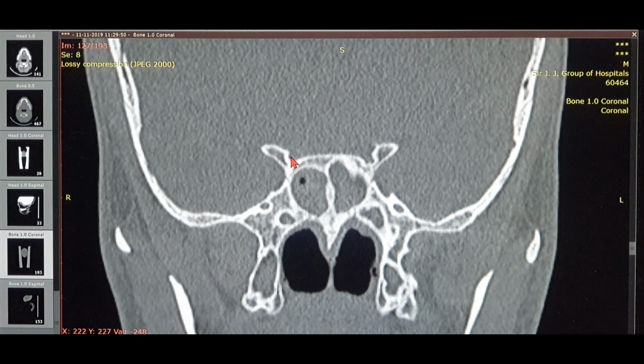Grade 1 is that the sphenoid sinus does not have any bony indentation of the optic nerve. Second is that slight indentation of the optic nerve you can see on the posterior lateral wall on its superior lateral aspect. Third is that the optic nerve is actually passing through the sphenoid sinus like a separate bony canal. So you can actually see the optic nerve as a separate canal within the sphenoid sinus. And what is grade 4? Grade 4 is the same thing as grade 3, but that is extending up to the posterior ethmoids as well. So that is the Delano classification for you guys.